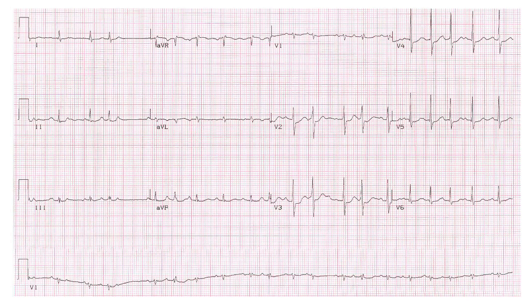So if I'm looking at lead V3, here's a P wave here. I can't really see a discrete P wave here, but here's a P wave, and this looks like it might be a P wave. Again, the P wave may be in conjunction with a T wave here. Here's a P wave, here's a P wave. I think I could talk myself into a P wave here, especially if I move up to lead V5. Again, it may have been buried here in the T wave, but that's a definite discrete P wave, and this is a discrete P wave as well.